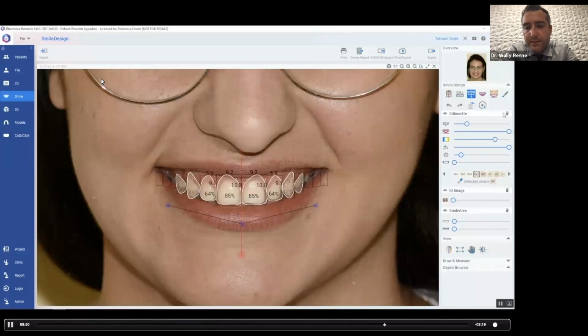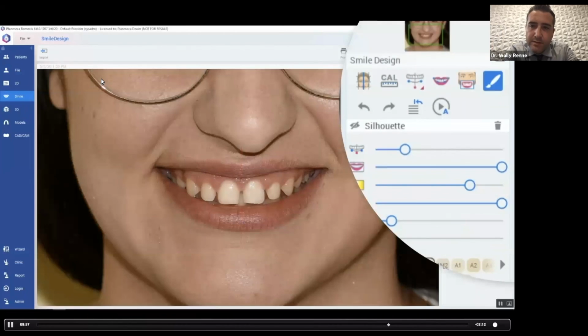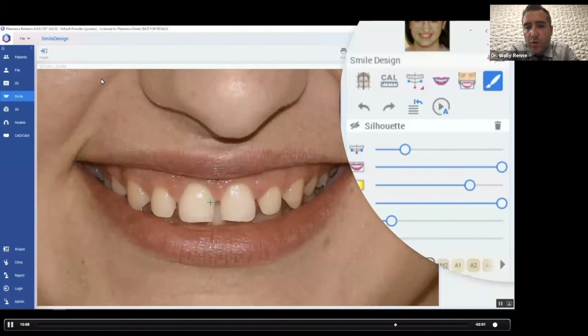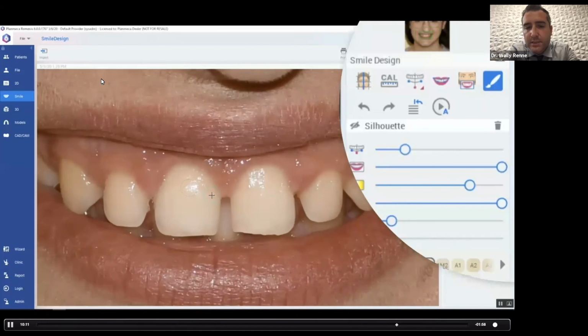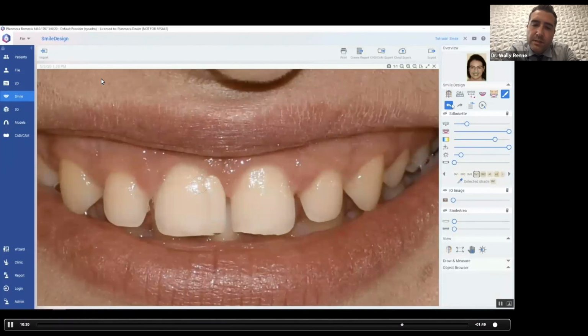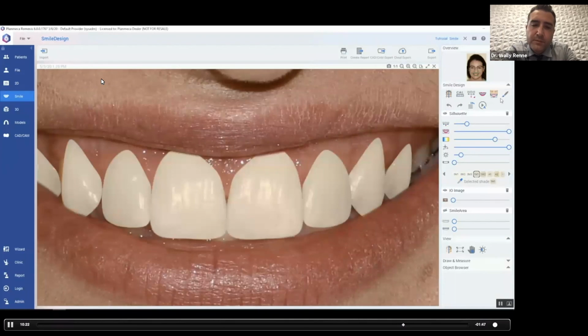But before we go on to the 3D software, I want to show you one last feature, which is this kind of Photoshop for faces. So I hit the little brush icon right there, and I get all these new tools. There's a ton of cool new tools. There's Warp, which lets you drag tooth structure. There's Mirror and Clone. Clone, I'll show you Clone real quick. Clone essentially just, you click an area to get your clone point, and then you drag, and it's copying that line. Okay, and you do have undos, so you don't have to be scared to screw everything up.